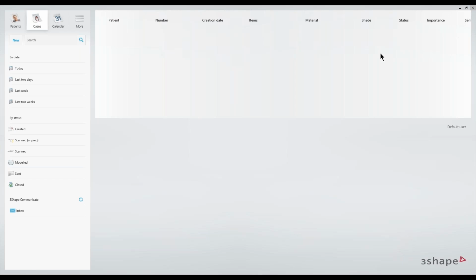Today, we're going to be going over Implant Studio implant planning and surgical guide design. For the first case we're going to do, it is just a single tooth-supported workflow. Implant Studio can do the edentulous workflows, but we probably won't have enough time for that today.